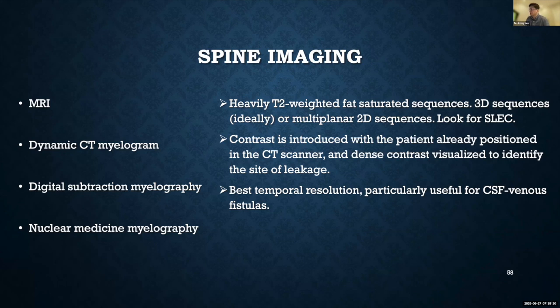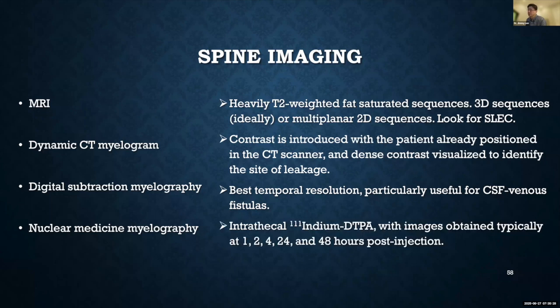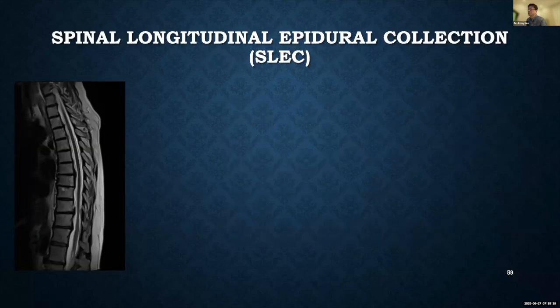It has the best temporal resolution, but you definitely need good experience doing this, and it's useful for looking for fistulas. And nuclear medicine can be done too with intrathecal indium DTPA. The spatial resolution is very poor though, however. So here's an example of a SLEC on the MRI.